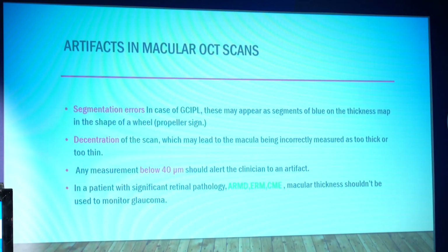So what can be the artifacts in the macular scan? There can be segmentation errors, decentration, or values below 40. And of course, in patients having ARMD, ERM, CME, macular thickness analysis should not be done.